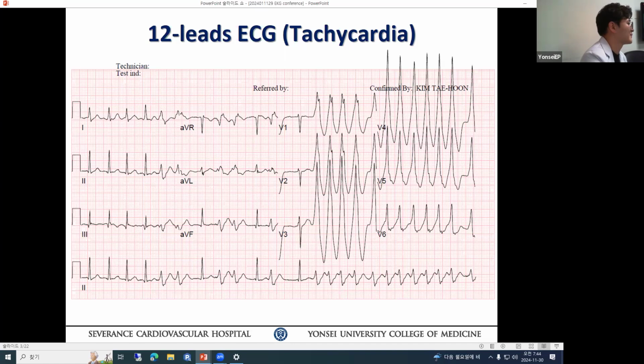So you say there are so many signs against VT, in favor of supraventricular, I mean atrial fibrillation with pre-excitation, etc. For me, it's VT. For me, it's not VT in general, but this positive concordance, first of all, is very interesting for me.